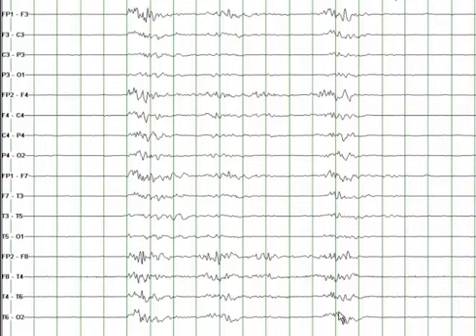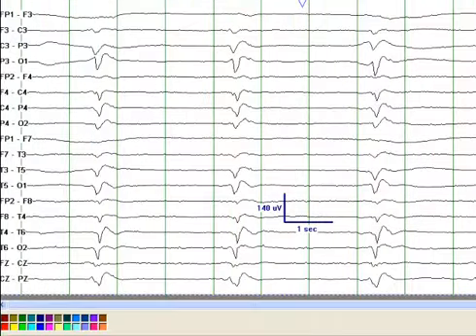As you increase the dose of the propofol, for instance, the duration of the burst will reduce from, let's say, 4 seconds to 2 seconds and further reduce to 1 second, and the intervals of suppression will increase. As you taper off the medication or the anesthetic agent, the periods of burst will increase and the periods of suppression will reduce.